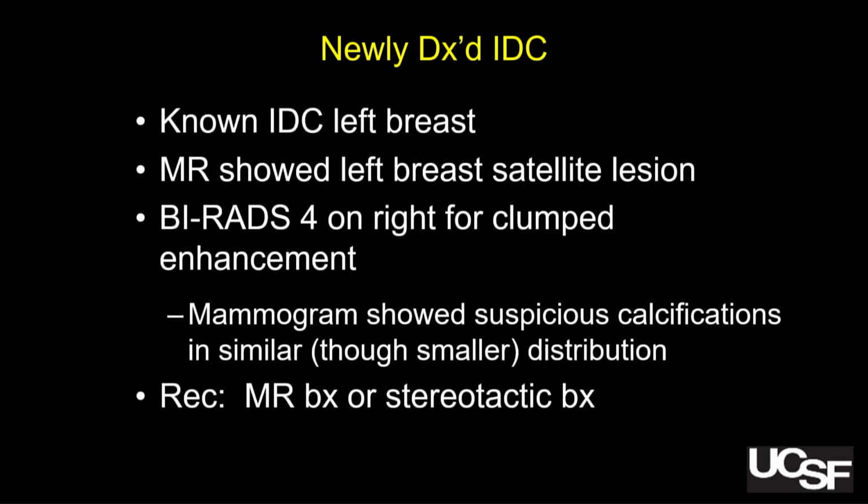But now the question is, do you do the MR biopsy or the stereotactic biopsy? So this is a judgment, right? Depends on your practice, which one may be most available, and also how sure you are that the calcifications you're seeing at mammography also match up with the MR biopsy finding. So that's a separate issue. But in general, when you see something on the contralateral breast that could be cancer, it's important to make that diagnosis now. So that's not a time where I would use a probably benign wait 6 months, because management is happening now and it would be important to exclude cancer.